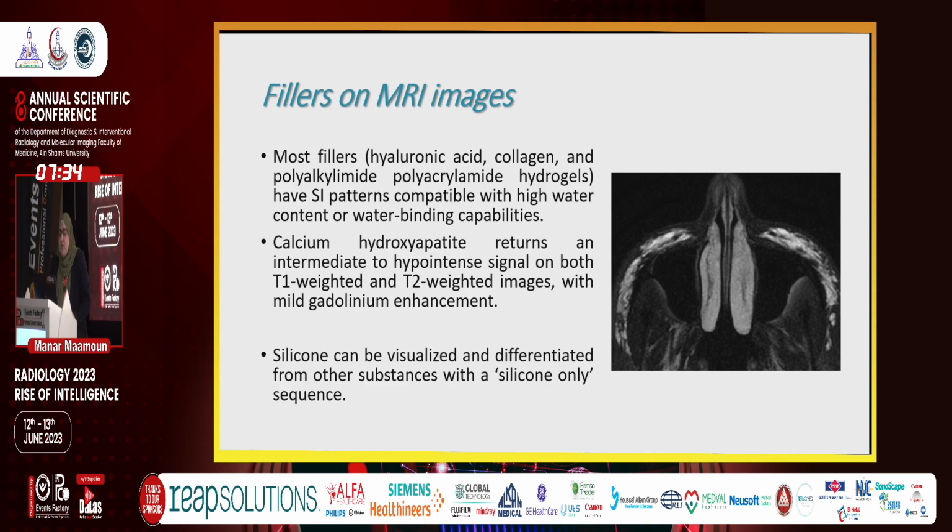Most fillers like hyaluronic acid and collagen show high water content, so they show high signal intensity on T2 weighted images and low signal intensity on T1 weighted images. Calcium hydroxyapatite, which appears like a calcific streak on CT, shows intermediate signal intensity in T1 and T2 weighted images. Silicone can be differentiated by silicone-only sequence. I'll show it later.